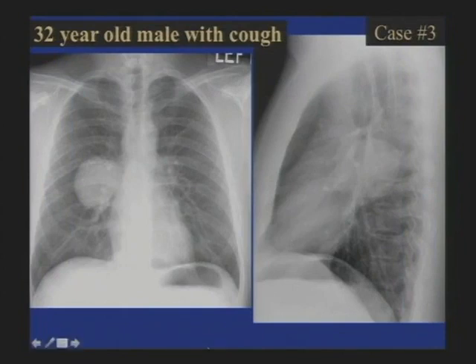Okay, young male, cough. This is kind of a radiology classic, although it's not well known. A funny story, we had a resident who was on chest, and one of our other attendings, Dr. Webb, showed him this case, and he said, this is a rare disease. And he came to me and he said, Brett, how in the world would you get this? Dr. Webb showed me this rare disease. And I was like, oh, it's this so-and-so. I had seen the case before and knew it was this rare disease, and we were playing with him a bit.